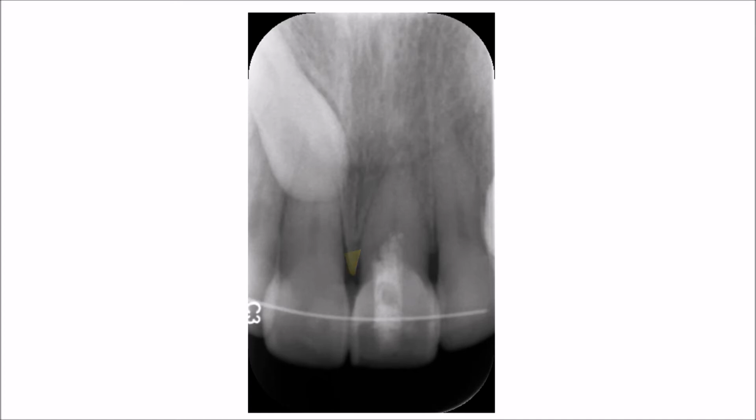appearance, and at the tip of this alveolar bone crest you would expect to see that the alveolar bone crest is homogeneous, of normal radiographic homogeneity, no pitting, no irregularities in the area. This is a normal appearance of the alveolar bone crest in the healthy anterior teeth.